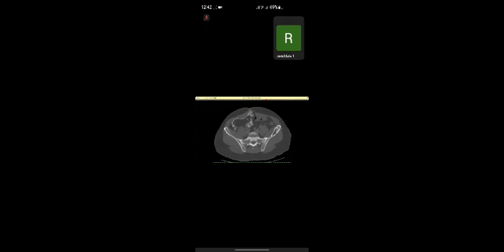There is a large lytic lesion in the left iliac wing, which has sclerotic borders and some internal specks of calcification. However, I do not see gross bony destruction. There is bony expansion, actually, and some internal ground glass matrix. I would like to see the soft tissue window. There is bony expansion, however, no destruction.